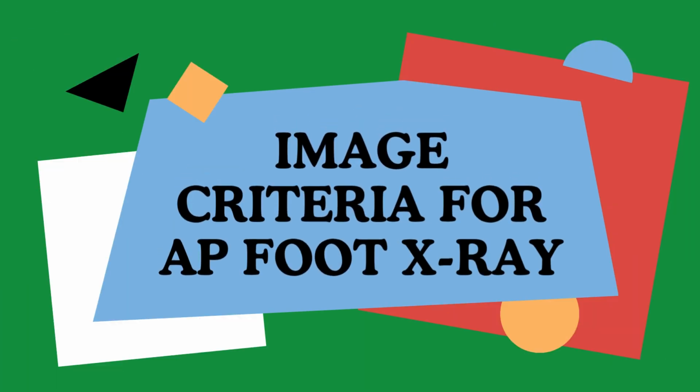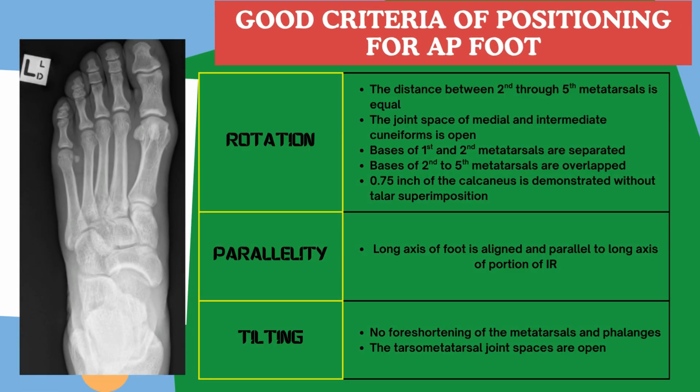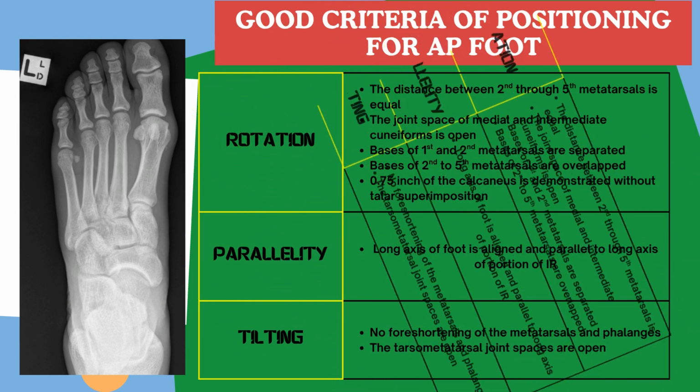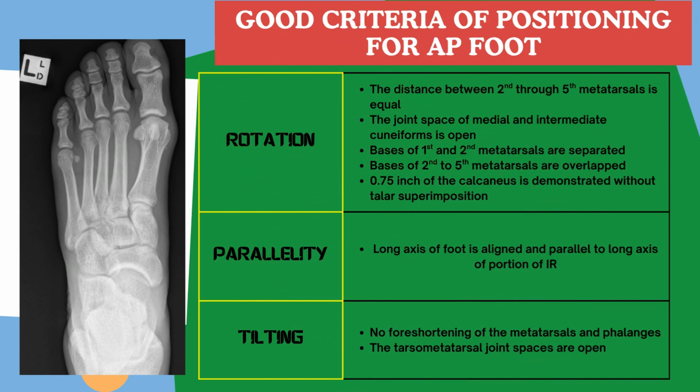Next, I will explain about image criteria for AP foot X-ray. There are 3 components indicating good positioning of AP foot X-ray, which are rotation, parallelity, and tilting. Let me go into more details about this. The first one is rotation.